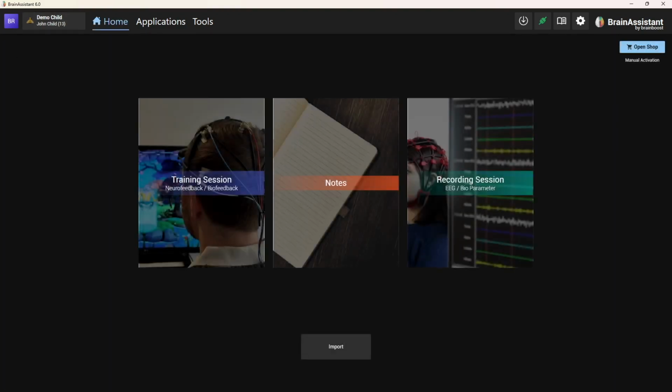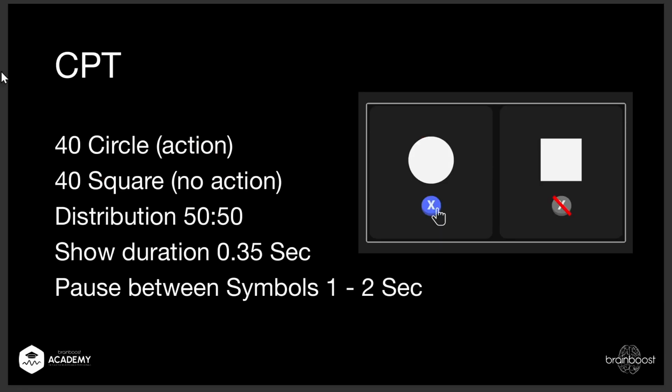So far so good. And now you see you can actually do a lot of customization if you want to. Of course, the default is pretty cool. If you change something, it will not mess up the default you have, so don't worry about it.